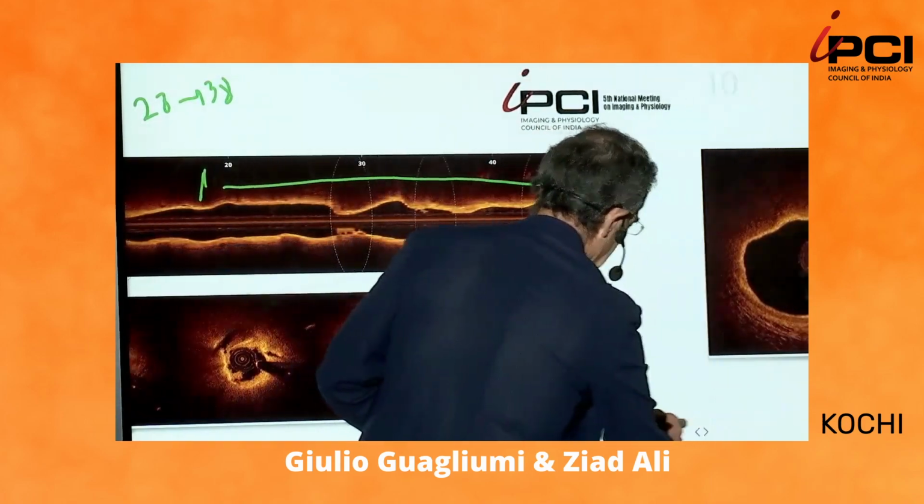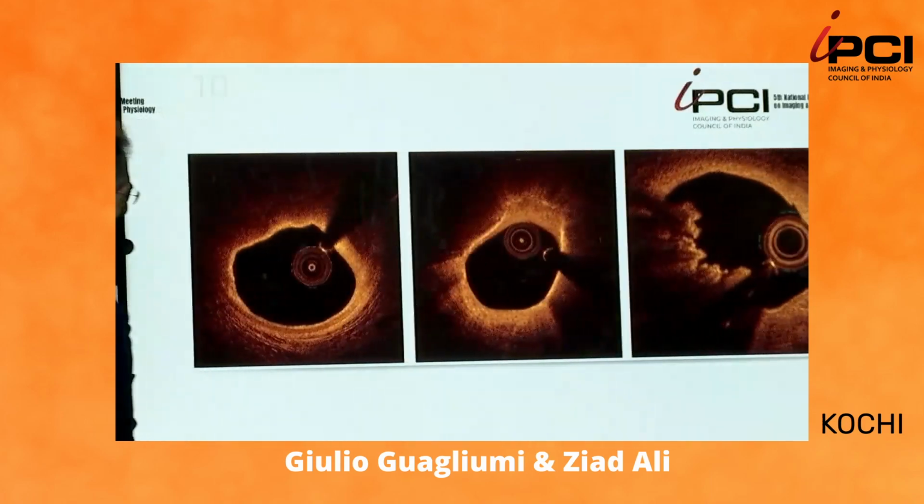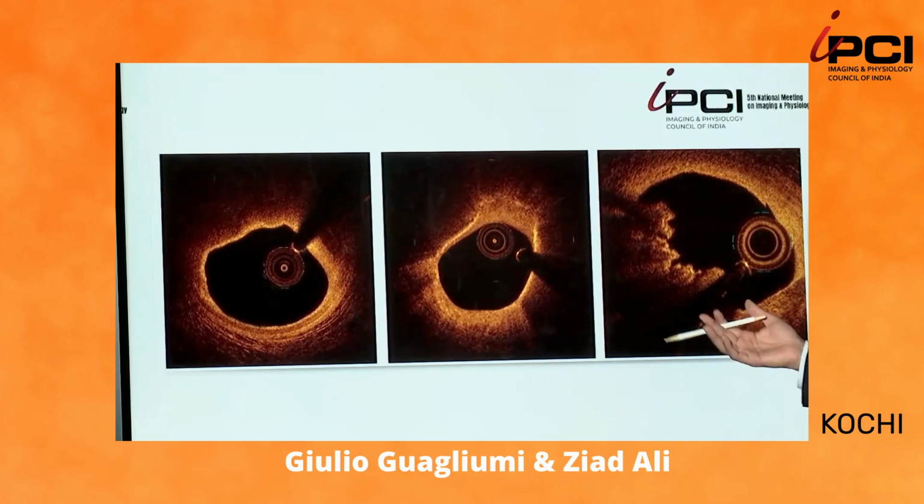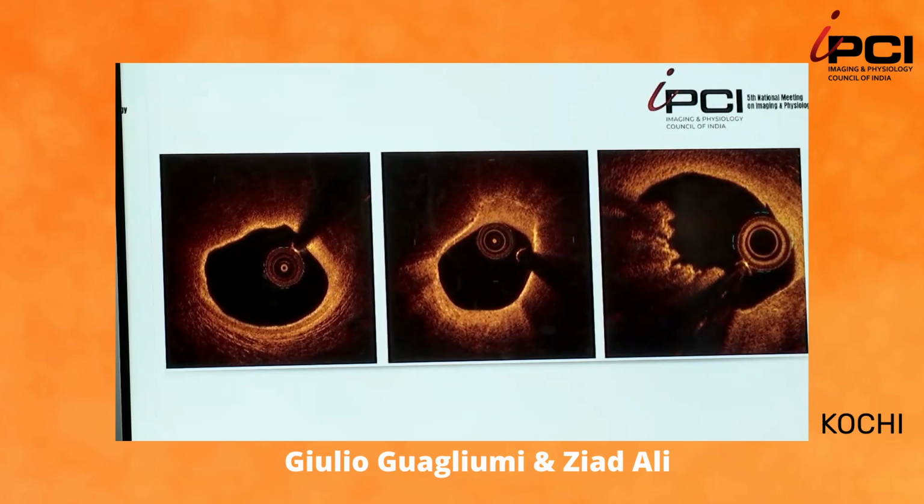Well, by OCT criteria, it's classically not vulnerable because it doesn't have a thin cap fibroatheroma. But if you were to extrapolate the PROSPECT 2 data from this, it has a very large lipid burden. And perhaps if we did an IVUS, I'd suspect the lipid burden would be greater than 70, and then we would say that it is. Three levels of instability. The first one is, who is answering?